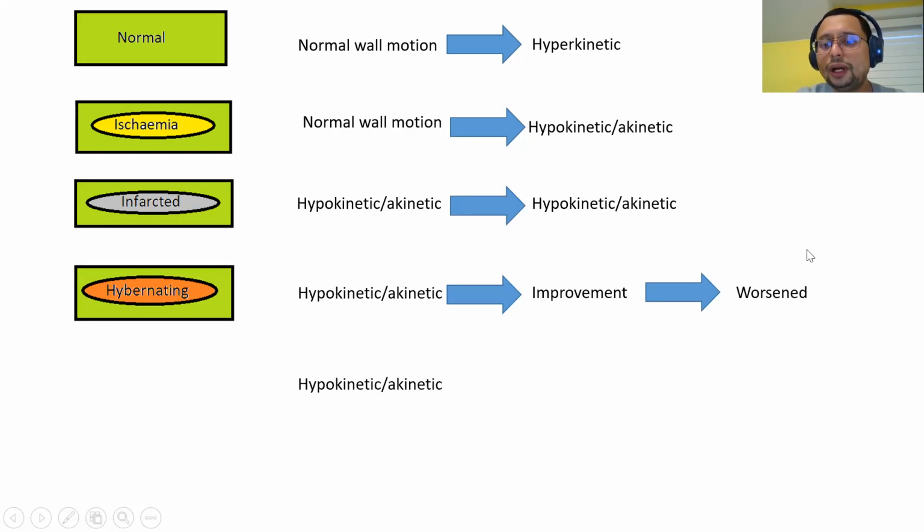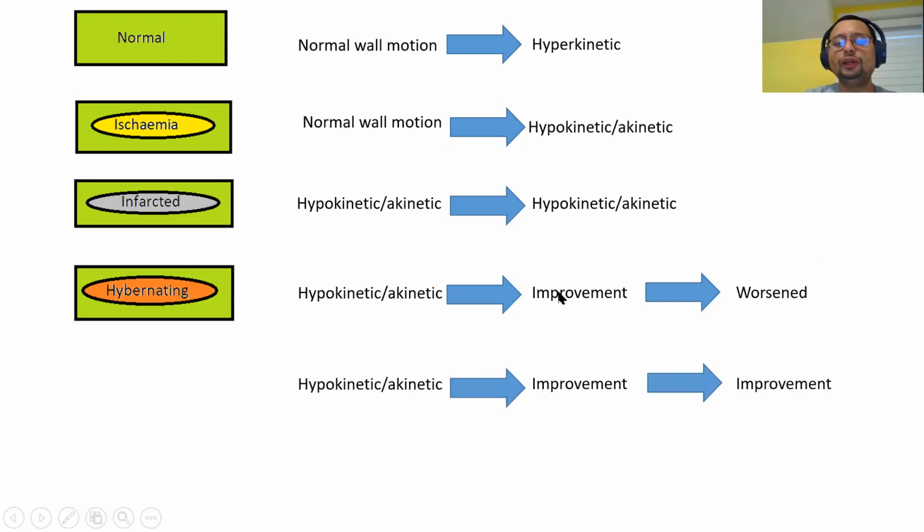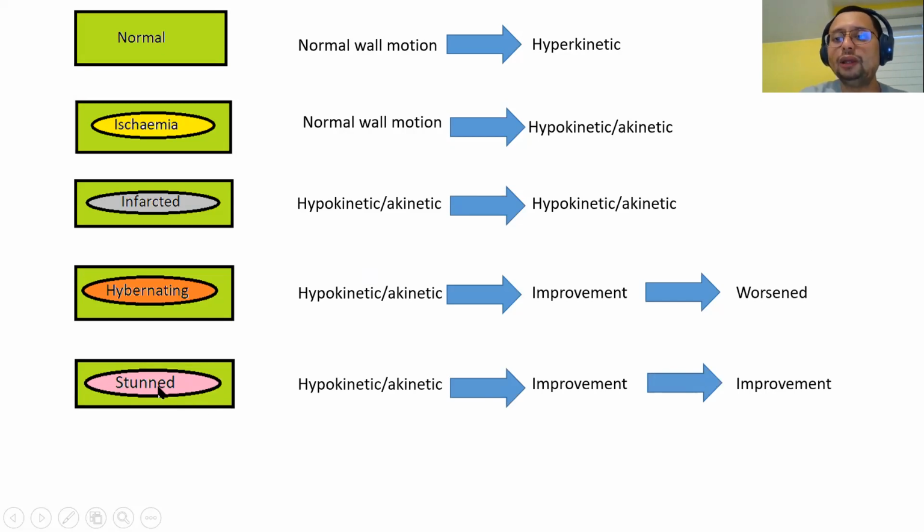What if your segment is hypokinetic or akinetic, it improves and continues to improve? That means that what you are looking at is stunned myocardium. You don't need to do anything. This is just a function of time. So when you wait, it will improve by itself.